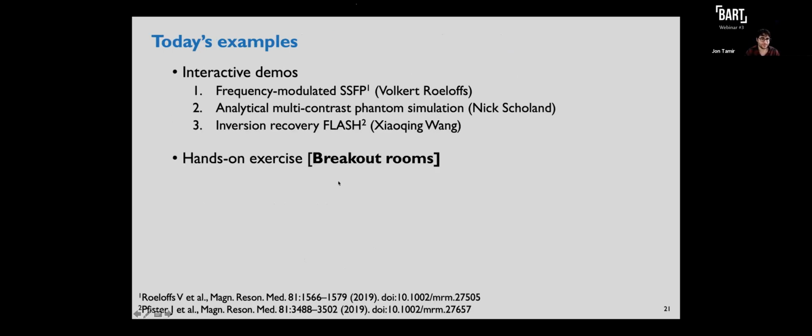Okay, so I didn't want to spend too much time on the presentation. I think the devil's in the details with these kind of things. So let's go ahead and get into the interactive examples. So just to summarize them again, we'll start with frequency modulated SSFP with Volkert. And then we'll go into analytical multi-contrast phantom simulations with Nick. And finally, inversion recovery FLASH with Xiaoqing, which will then get us into a hands-on exercise where we highly encourage you to follow along and fill in the missing entries. And we'll do that in breakout rooms so that we can offer you help as well. All right, so I'm going to go ahead and stop there.